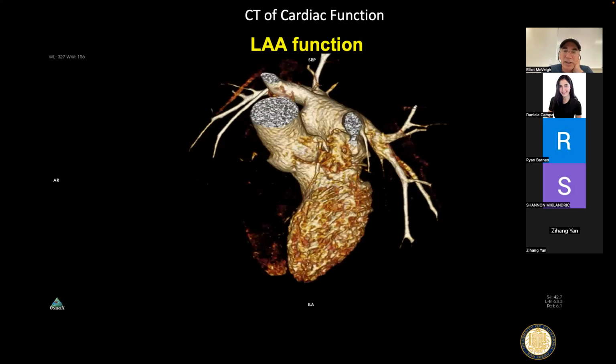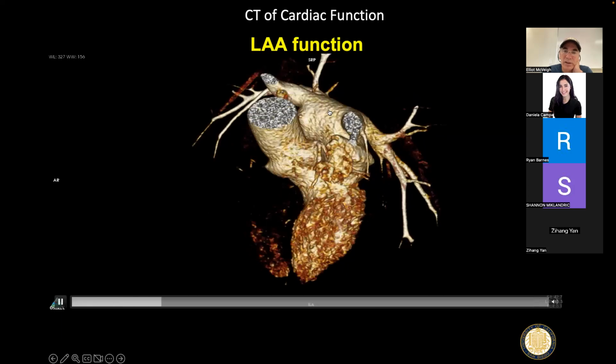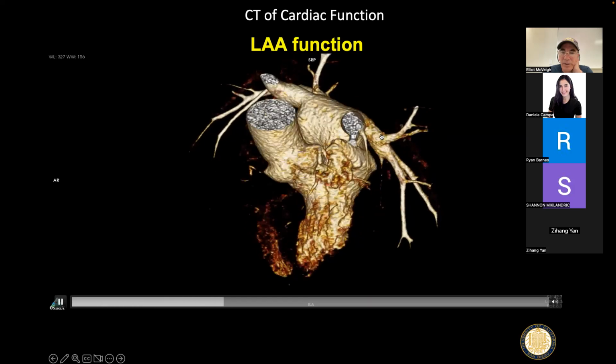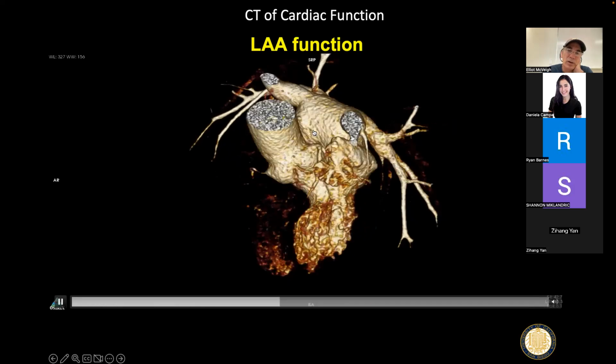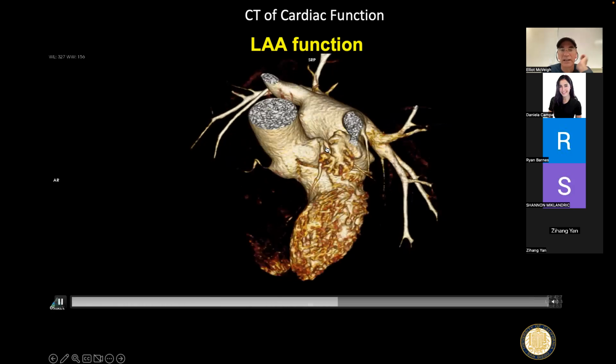And then if you look at the other side of the left atrium, here we are again. So here's the roof of the left atrium where it's contracting down. Here's the pulmonary veins out here, a stationary pulmonary vein, and here it's getting yanked on. This is the anterior wall, the one that's really moving, it seems, in your simulations or in your data.